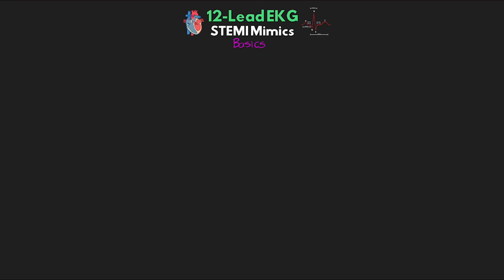So again, let's hit real quickly on our ST elevation. And again, I've already covered measuring the ST segment and the concepts of ST depression and ST elevation in the past 4 lessons. Again, if you need a refresher, please go back and watch those. Here though, I do want to reiterate that we ideally want to compare our ST segment to our TP segment when possible.